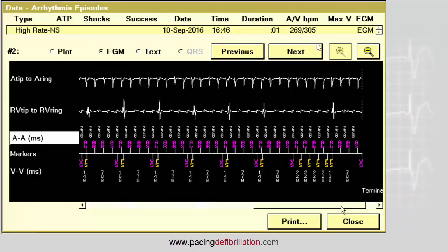In this patient, two options can be proposed: lowering the level of ventricular sensitivity to prevent the oversensing of the atrial activity. This, however, incurs a risk of ventricular fibrillation undersensing. The second option will consist in repositioning the ventricular lead.